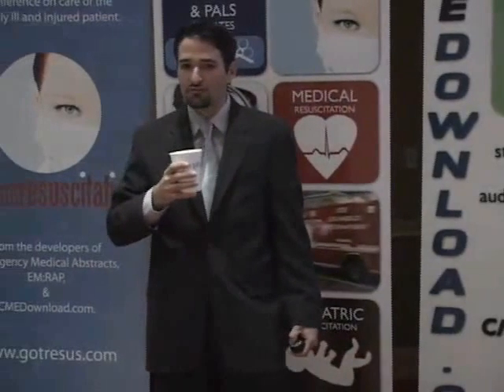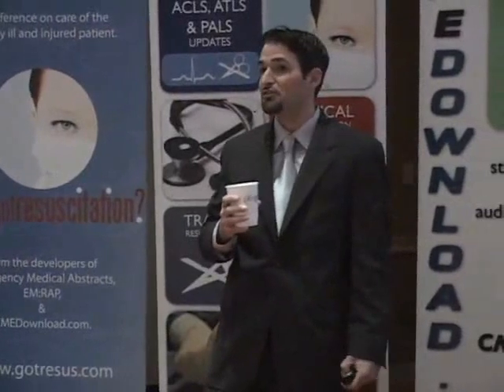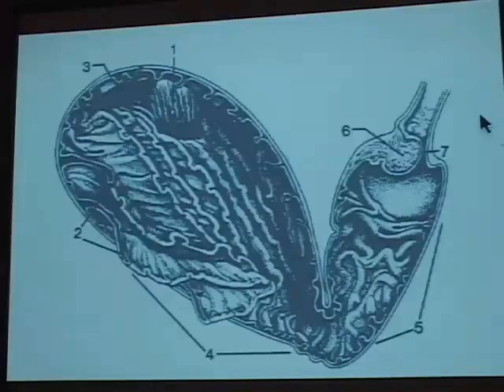So several pitfalls. Bowel gas, we talked about that. Not visualizing completely. Mixing up the IVC and the aorta. Measuring in the incorrect plane. Remember, it's got to be AP transverse. And measuring inner wall to inner wall. Biggest failing is probably to not consider it on your differential and just assume that that flank pain was actually a kidney stone.